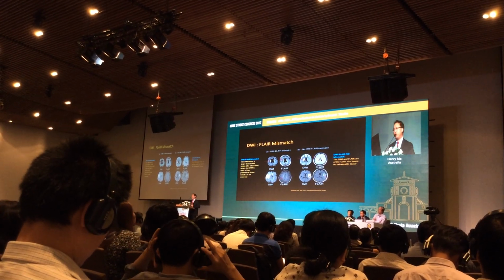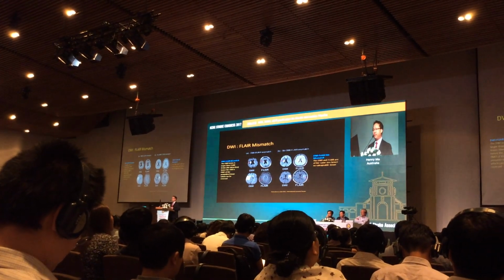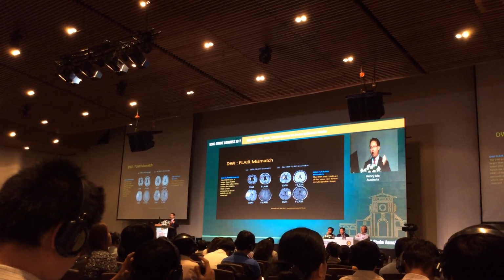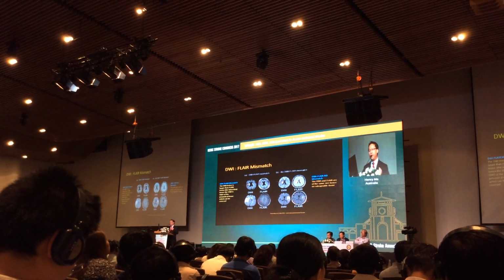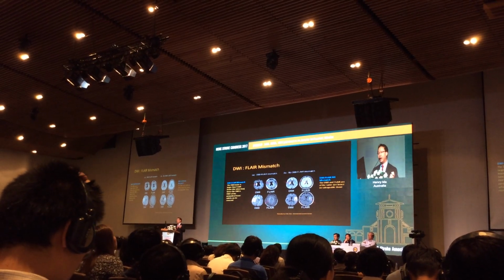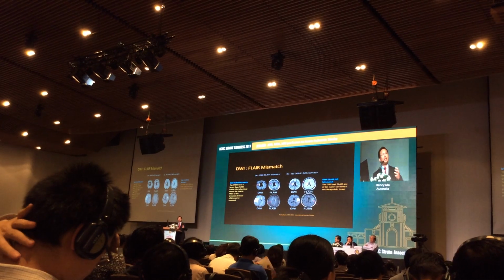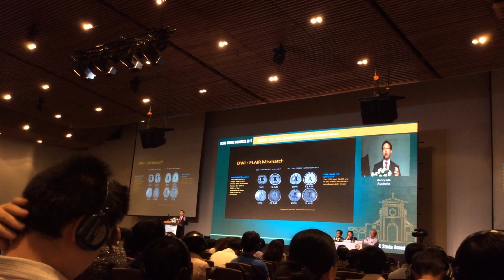So for example, you look at column A, the first two cases. The DWI is a small dot, and on the Flair, you cannot see a corresponding Flair change. So there is a DWI Flair mismatch. The bottom one, in column A, there is a big DWI lesion on the right, but no corresponding change on the Flair. So it means that this DWI lesion can probably still be salvaged because there are no Flair changes.